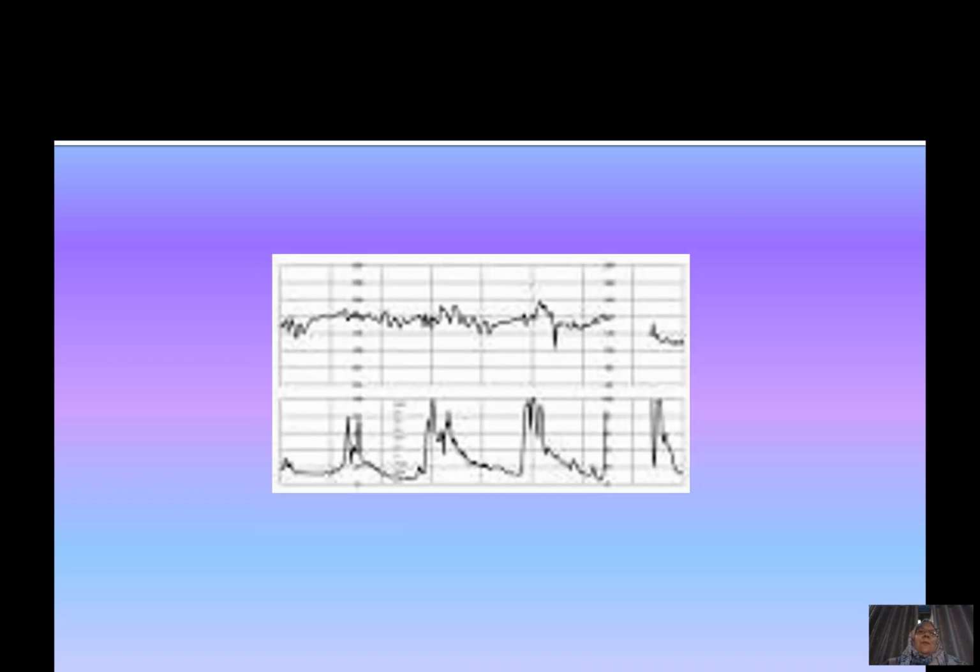So again, take a few seconds to look at the CTG and write down the parameters in a systematic way. Yes, let's start together. This patient again has got contractions, and you can see again they are about 3 in 10 minutes. You can see the two lines going through the CTG. They say 10 minutes, so 3 contractions in 10 minutes.